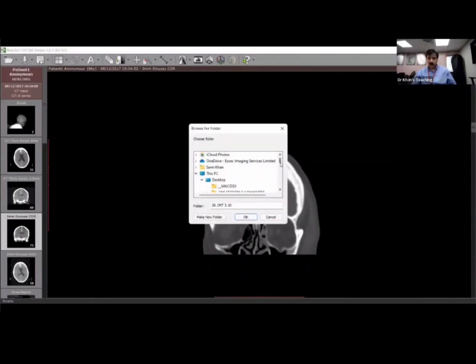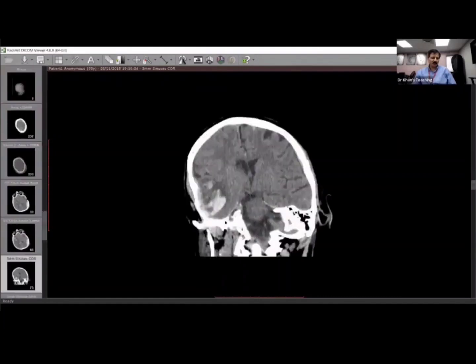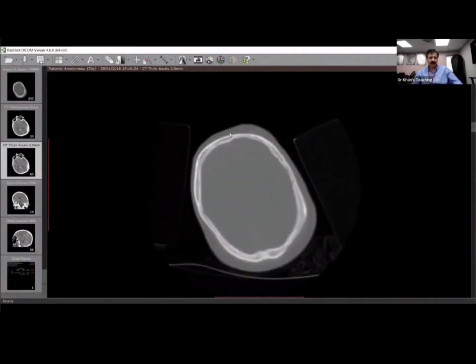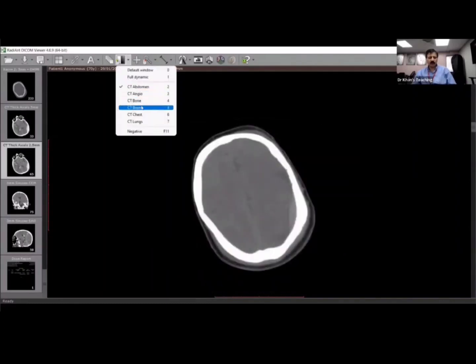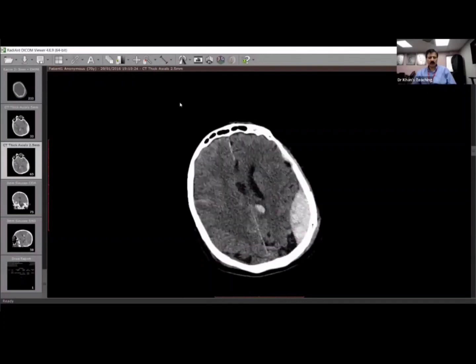Are you still interested in another case? Sure, sir. Okay, let me show you a case of multiple findings. So till now I have shown you subtle cases, right? Subtle, you've done very well. But now I am going to show you a sort of a very busy scan. So busy scans also come in the examination, and the findings will be very easy to pick up, but there might be some discussions, and the key point is that you have to pick up everything.